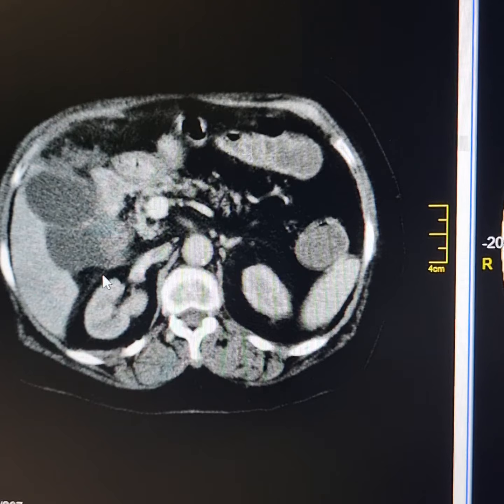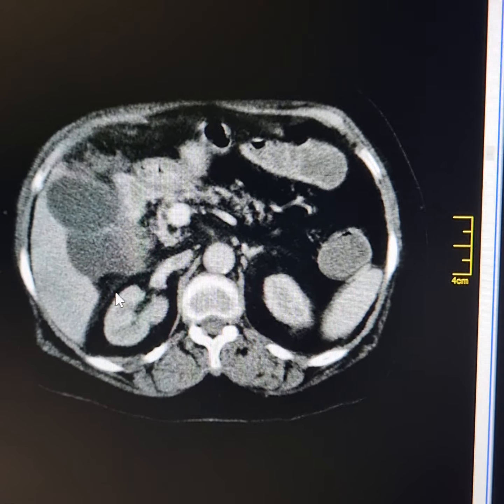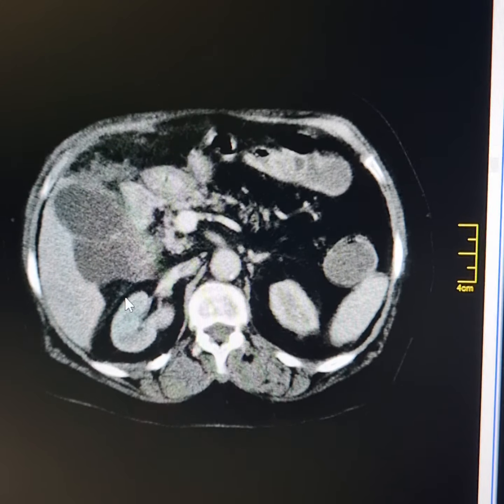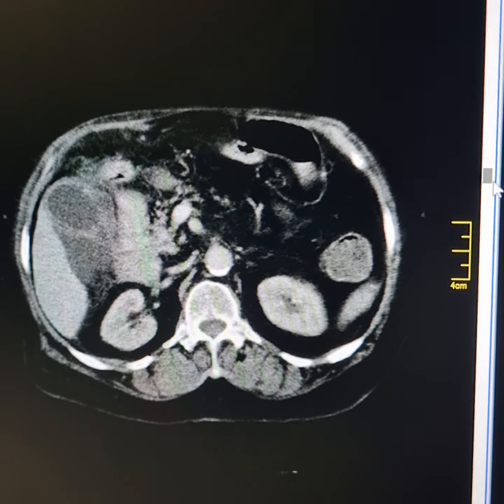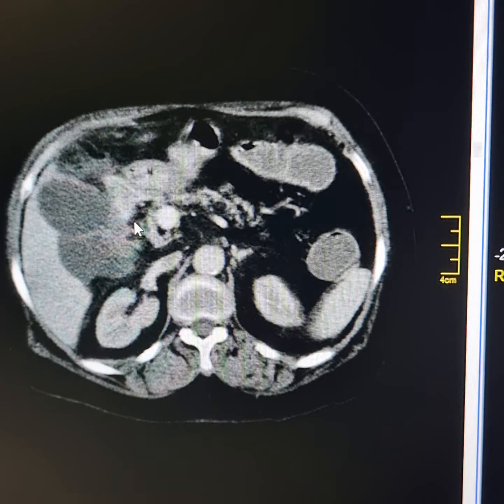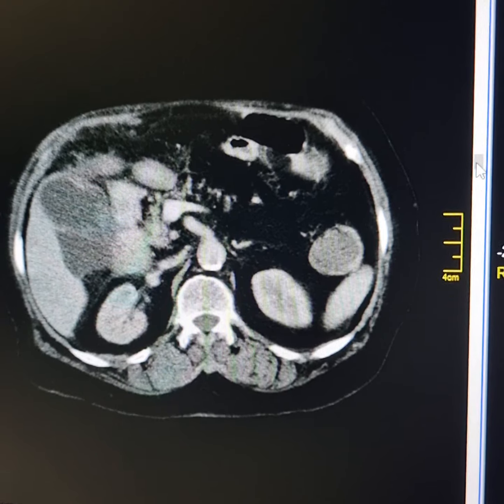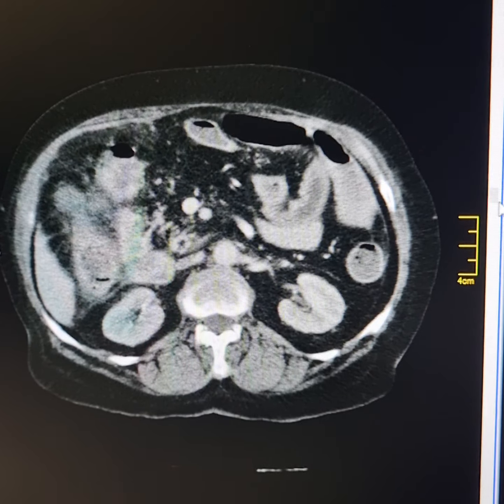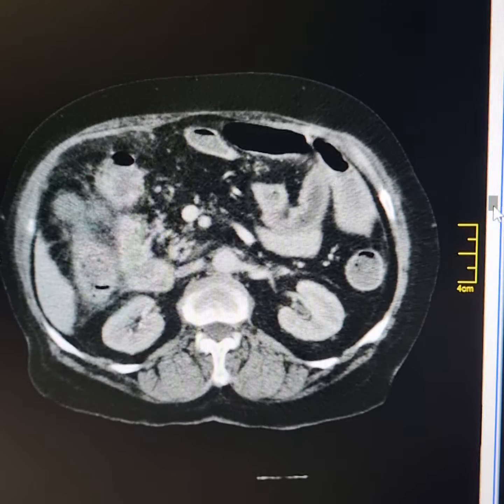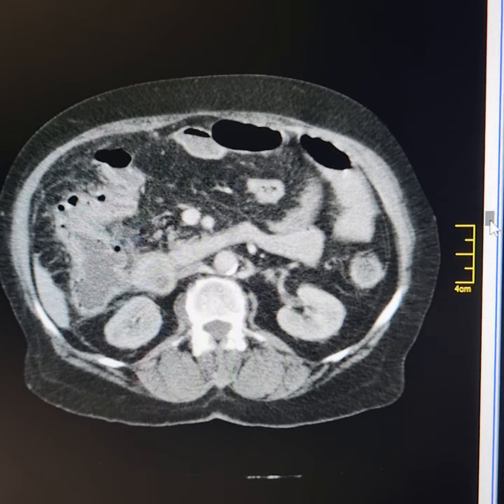This is not a pericholecystic abscess, because if it was an abscess then this should have a wall around it which would have enhanced with the contrast medium. Now please observe that there are inflammatory changes in the adjacent wall of the second part of the duodenum. Density of pericholecystic fat is increased, along with increased density of fat in the right hypochondrium.